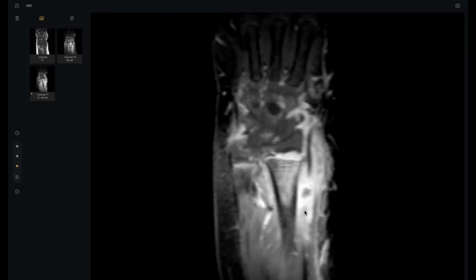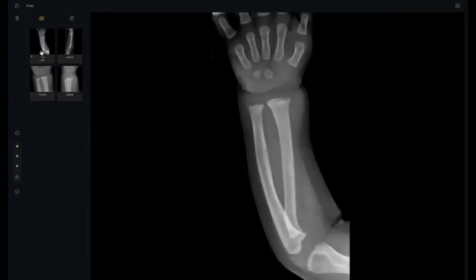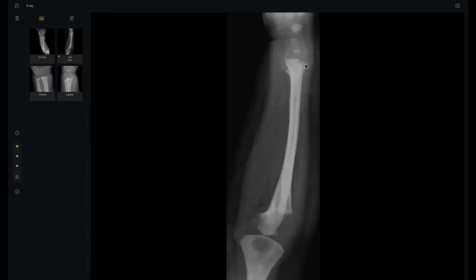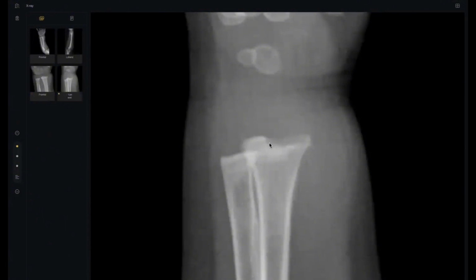Thank you, Dr. Suman. What happened here? This is the X-ray from the beginning, really not conclusive. Ask for the lateral. There is at least some irregularity or periostitis. Ask for zooming. This is not normal. There is sclerosis, and I think this is lucency here. No extraosseous soft tissue. No cortical break here, but this metaphysis is not a healthy metaphysis. There is some rarefaction or erosion.